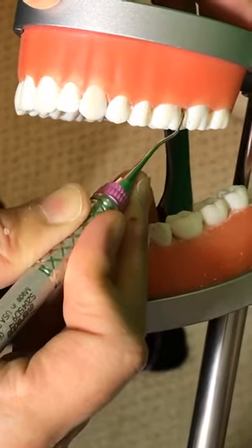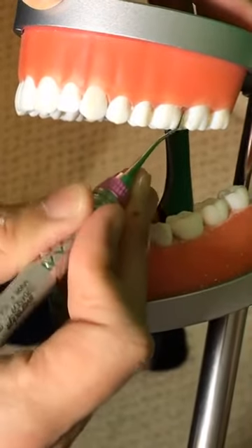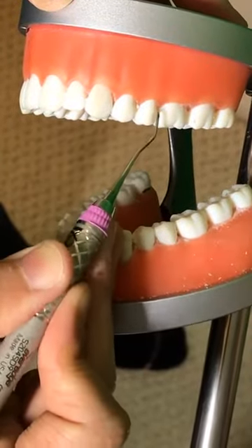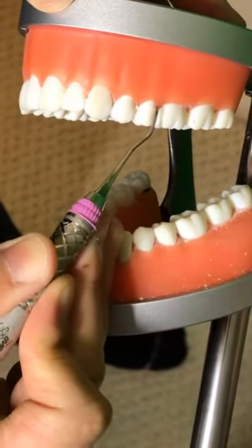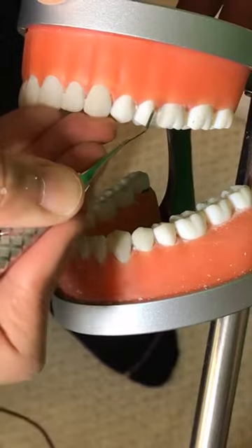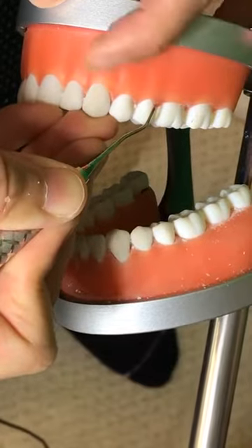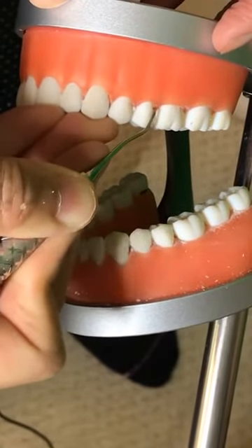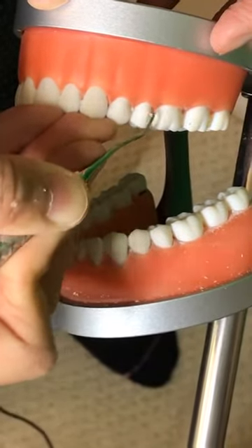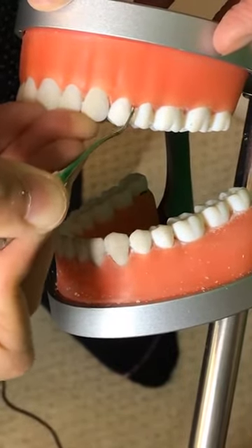So sharpening, we should do this as soon as you notice a dullness. This time I cannot do it. Or you can come up here into oral and then close this terminal shank a little bit more towards the tooth side. Very small strokes. All right, so something like that.